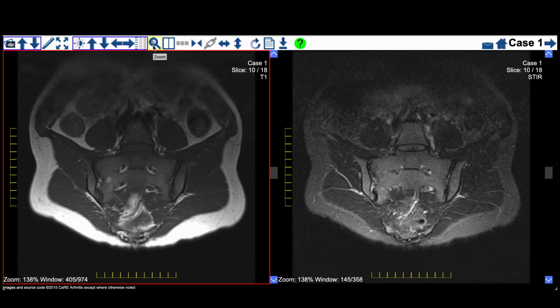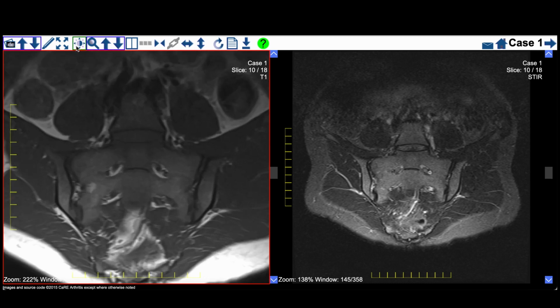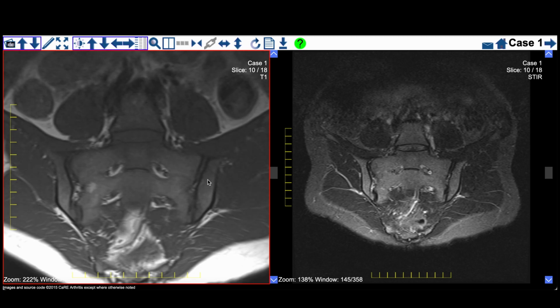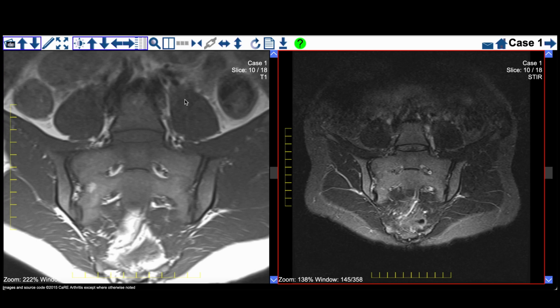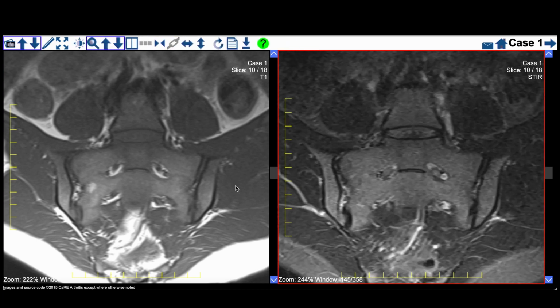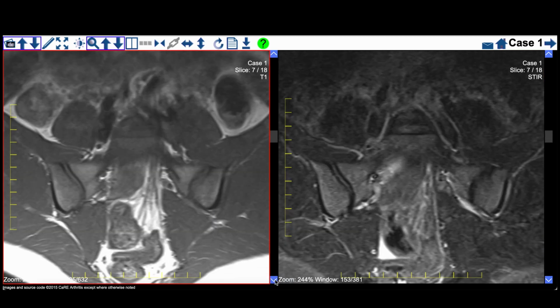The DICOM image viewing software allows you to magnify the joint, and in addition we can alter the brightness and the contrast, and that's what should be done to optimally view the sacroiliac joint. And we can see as we scroll from front to back that first of all we do not have erosion in this joint, because we have two dark parallel lines indicating that there is no erosion.